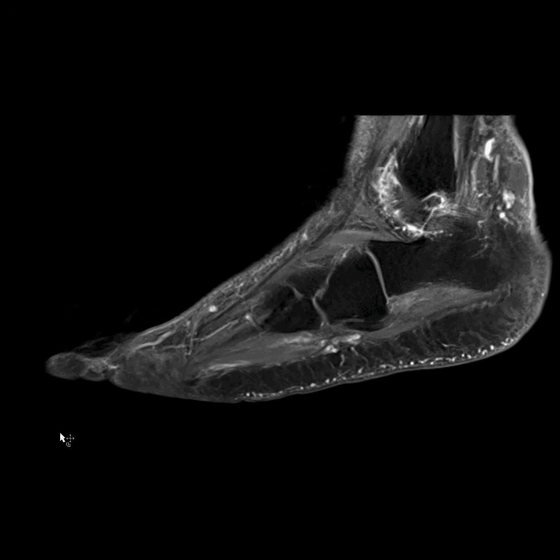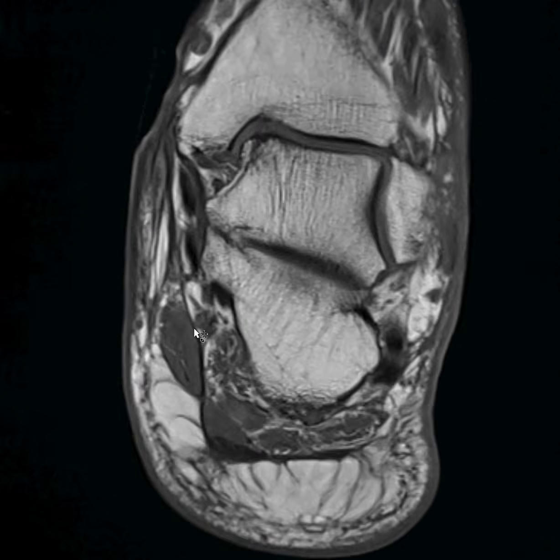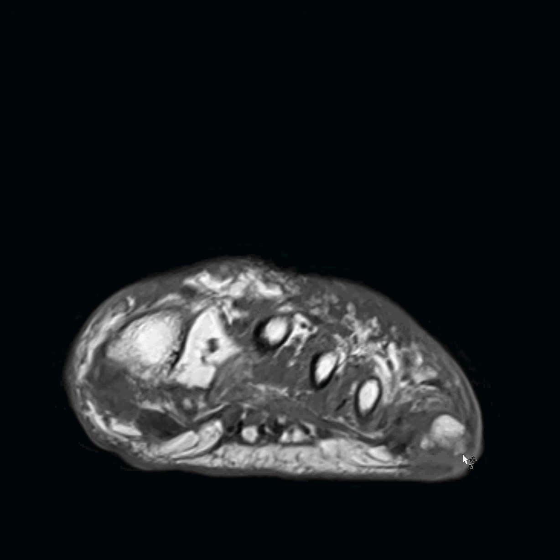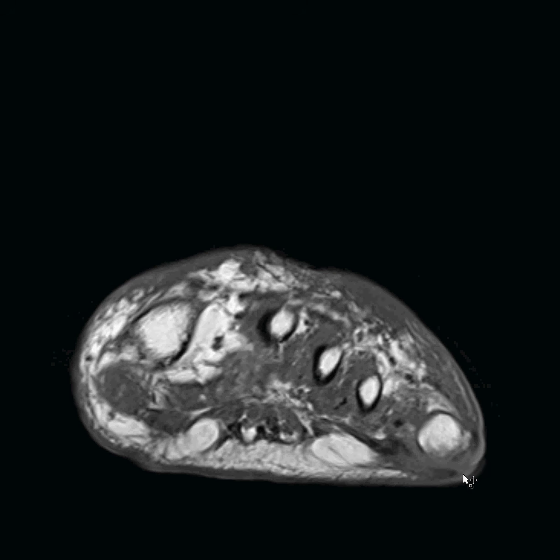In addition, the person had an ulcer, let's see if I can find it, out here by the fifth metatarsal head. So this is well covered. This is good, we always do like axials through things, or short axis in this case. But then again, looking at it in the other plane, since the ulcer is right here, it would have been best to capture it in this plane so we could see its relation to the bone. Instead, what was done was a sagittal image where it's hard to say if this signal abnormality is genuinely in the bone or is it partial volume averaging with the adjacent soft tissues.